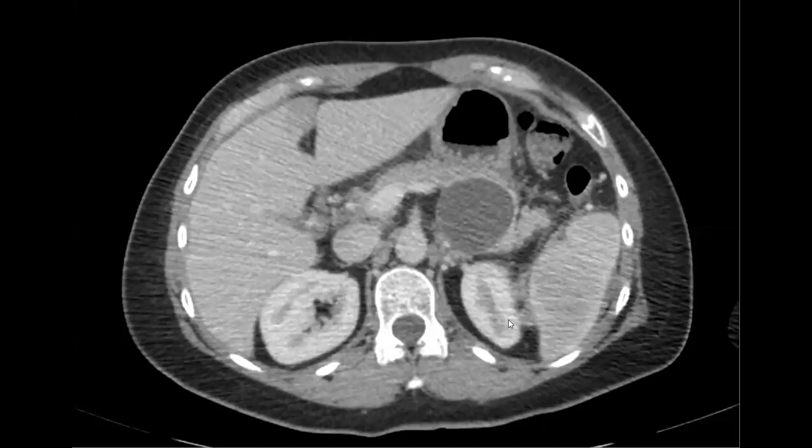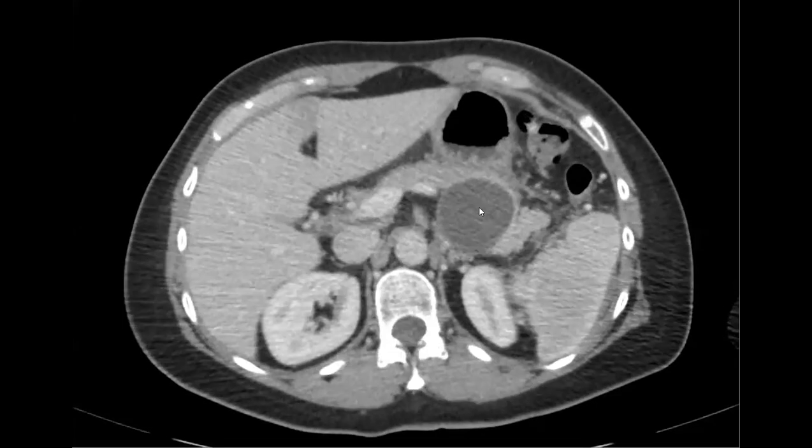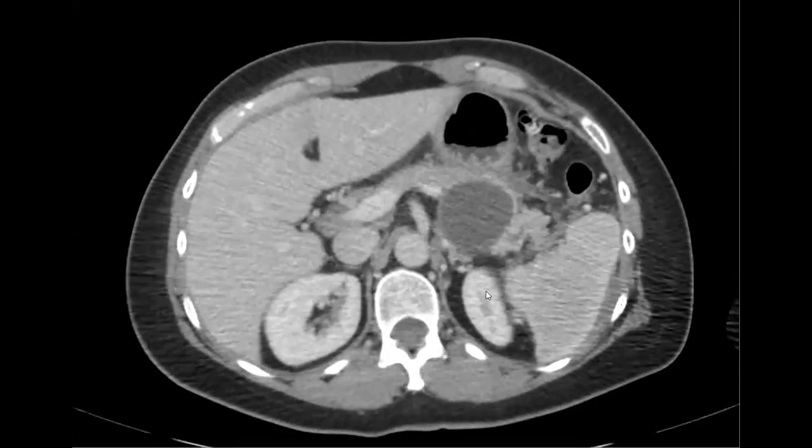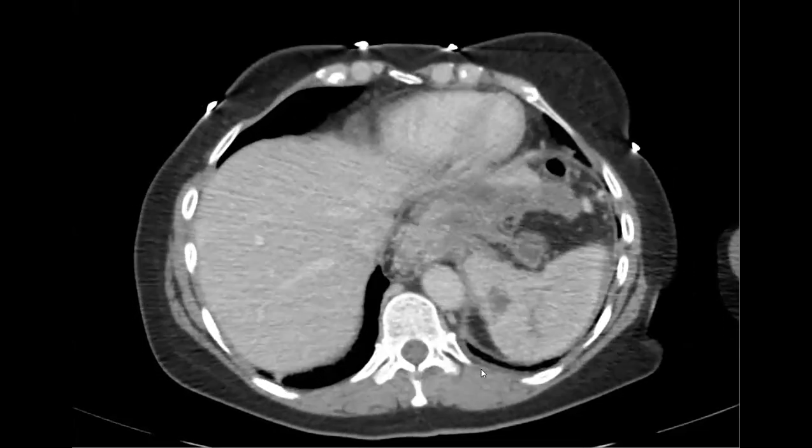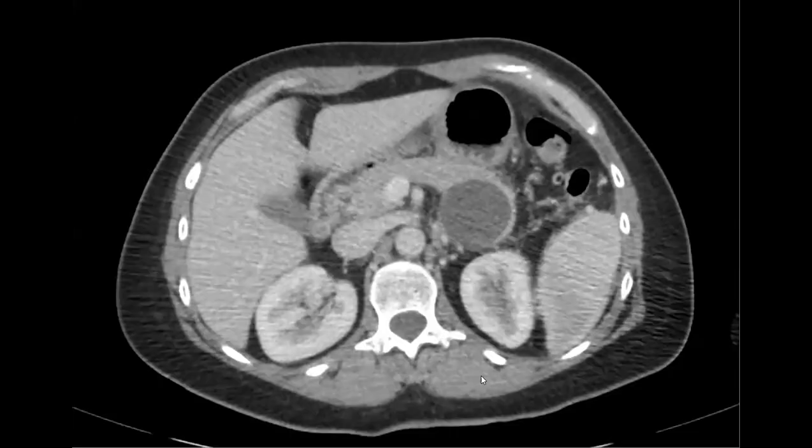The other thing is I've been tricked by this before, where they'll say history of pancreatitis, and then you see something like this and just think, oh, pseudocyst. Don't jump straight to that conclusion, because it can be tricky. When it's round like this, you really want to see a prior exam showing a totally normal pancreas, then pancreatitis, and then a pseudocyst forming over time. You don't want it to be presumed pancreatitis because they had pain or something. Occasionally MCNs can cause pancreatitis. So this was a tricky case where both were happening.